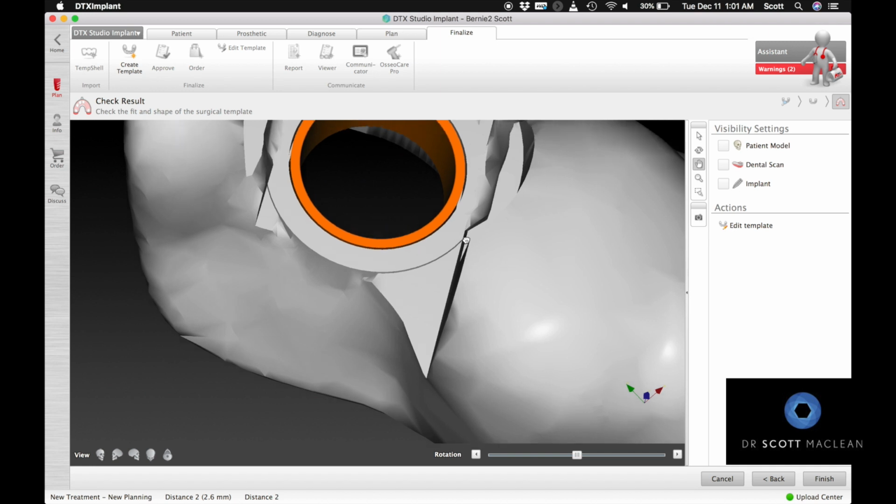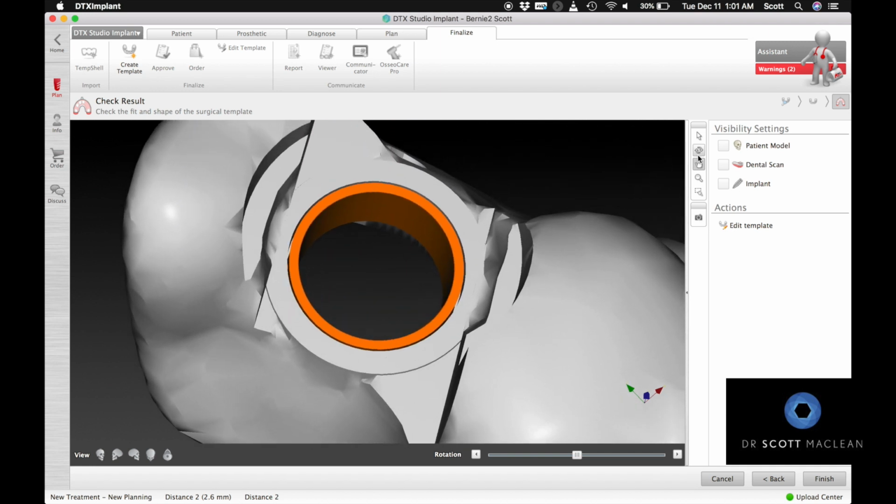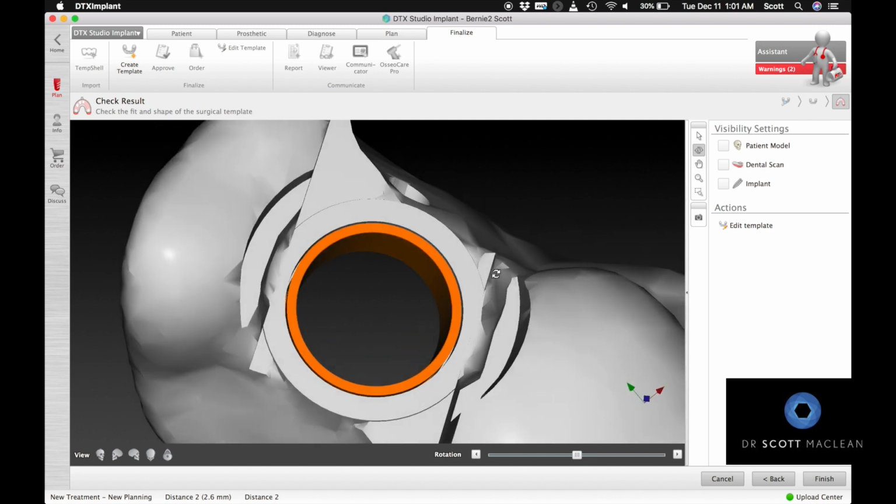So this ring is how far from the top of the implant? 3 millimeters? Okay, how many say 9 millimeters? Never mind, how many want to phone a friend? That wasn't my final answer. That's not your final answer? Okay, so how far is that from the top of the implant? 9. And so it's going to be 9.